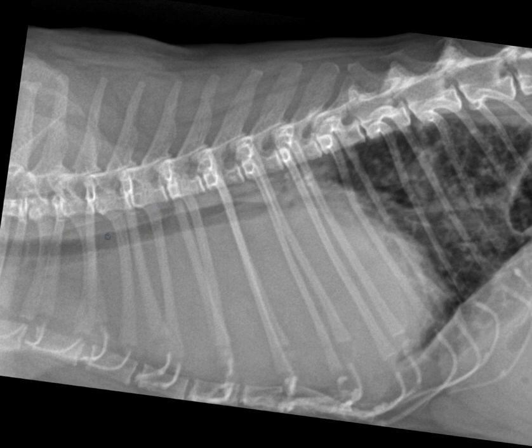Of course, the trachea is displaced dorsally in this case, and although that can be a sign of cardiac enlargement, and I don't think we see enough of the heart here to really exclude cardiac enlargement in this case, remember that craniomediastinal mass effect could also push that trachea up.